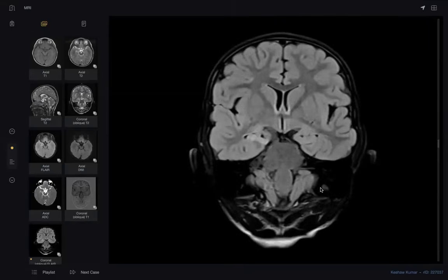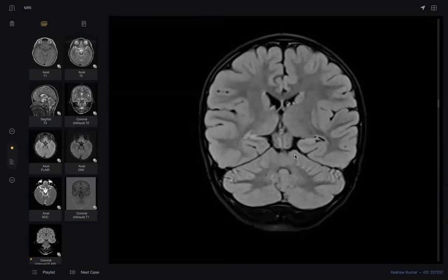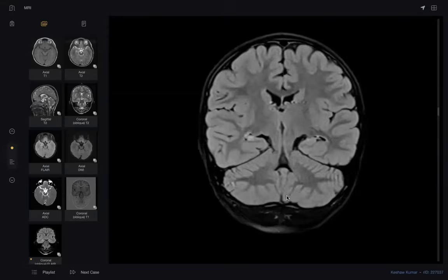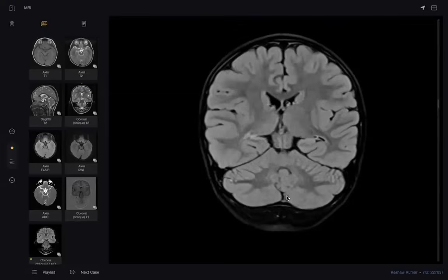So I will also look at the mammillary bodies and the fornix because they also show some changes. I can see the mammillary body over here is reduced in volume as compared to the left side. And the fornix, I can see the fornix is also reduced in volume. So this is right-sided mesial temporal sclerosis. I will convey my findings to the referring physician, and this could be treated medically.